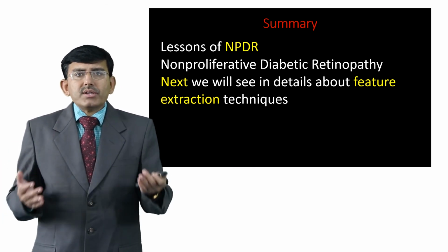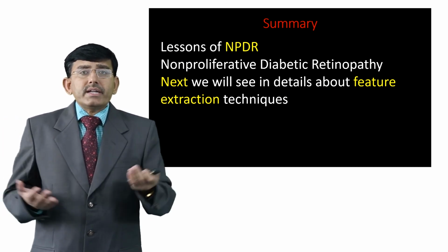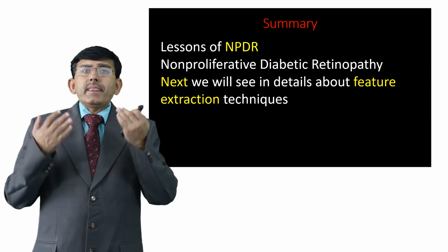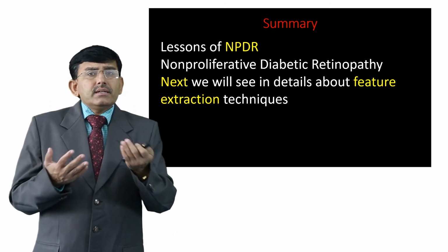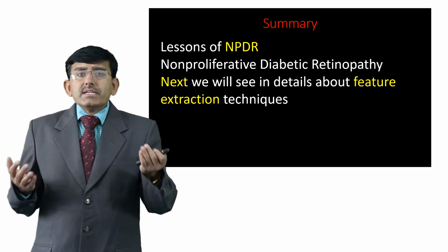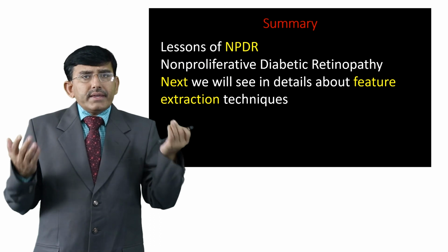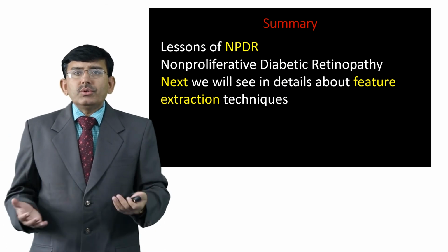We have come across in this module lesions of non-proliferative diabetic retinopathy. Next, we will see the details about various feature extraction techniques and their classification techniques too.